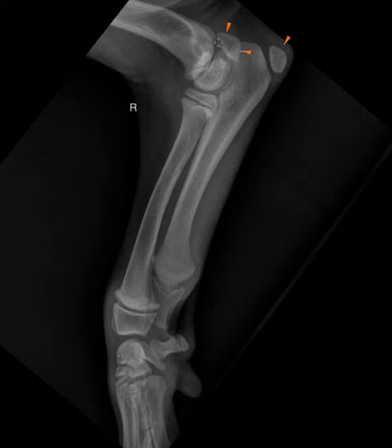We also have, of course, our distal humeral physis, which I'm showing here, and the proximal radial physis. Here's our distal radial physis. So remember, that means that the carpus is going to be here. This is going to be our distal radial physis. And then our distal ulnar physis, which is that funky V shape that we all kind of get used to seeing.